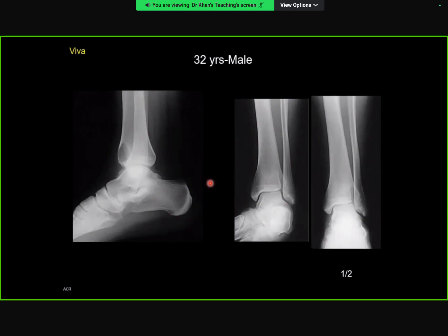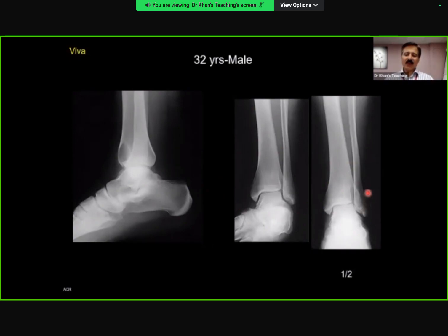So it has a narrow zone of transition, it's a benign lesion in this location, which is not entirely epiphyseal. I would include a hint. Reconsider. Has it gone into the epiphysis? It is epiphyseal, sorry. Right?